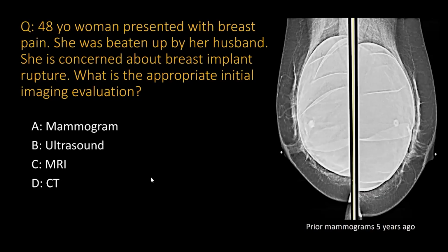A 48-year-old presented with breast pain. She was beaten up by her husband. She's concerned about breast implant rupture. I'm just showing you her mammogram from 5 years ago. She has no recent mammogram. So what's the appropriate initial imaging evaluation for this patient?